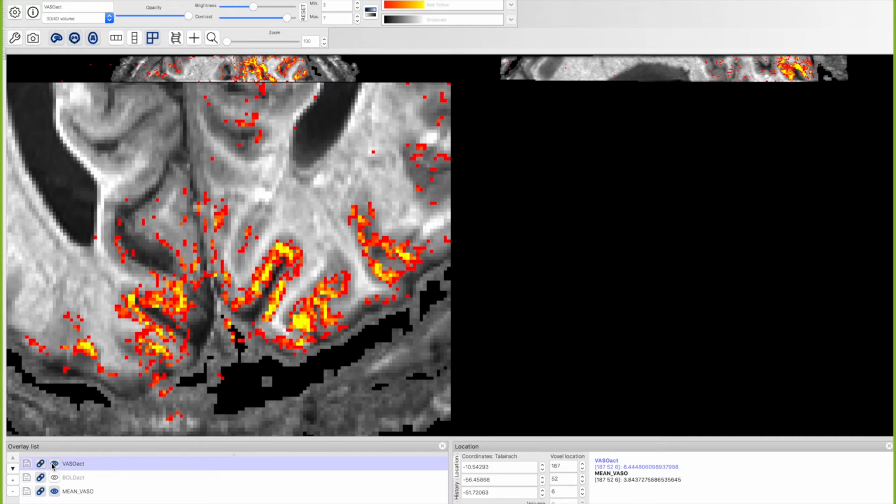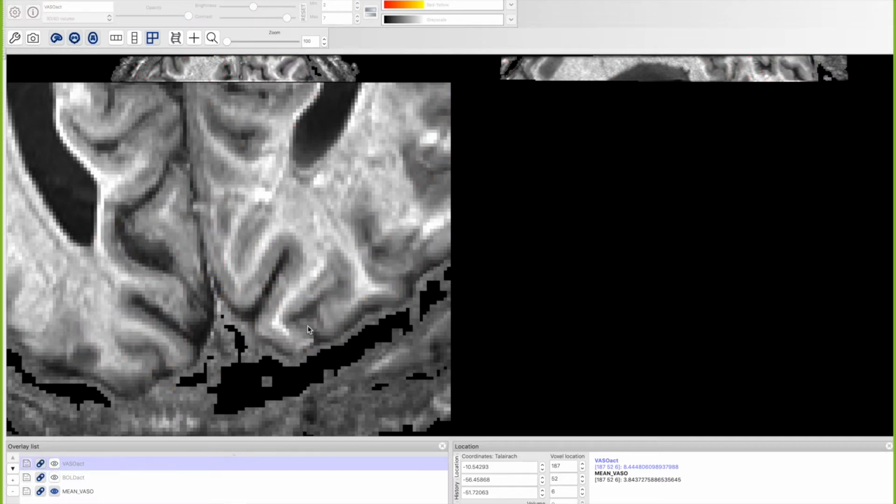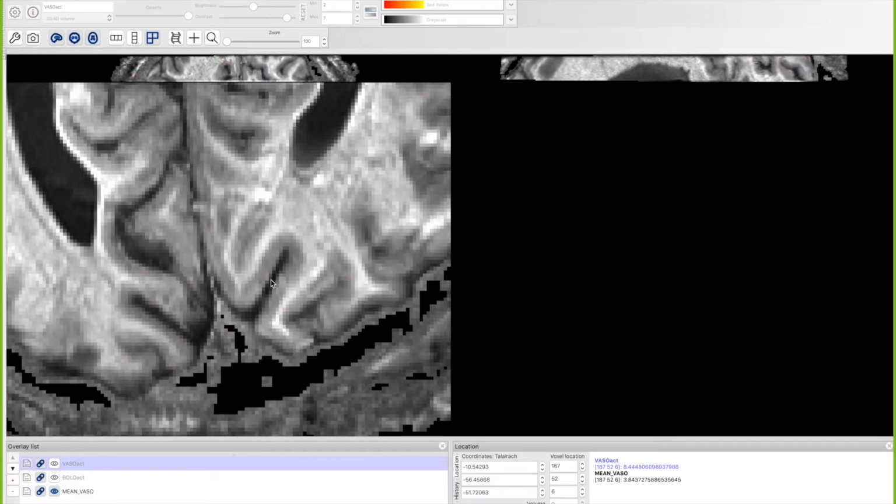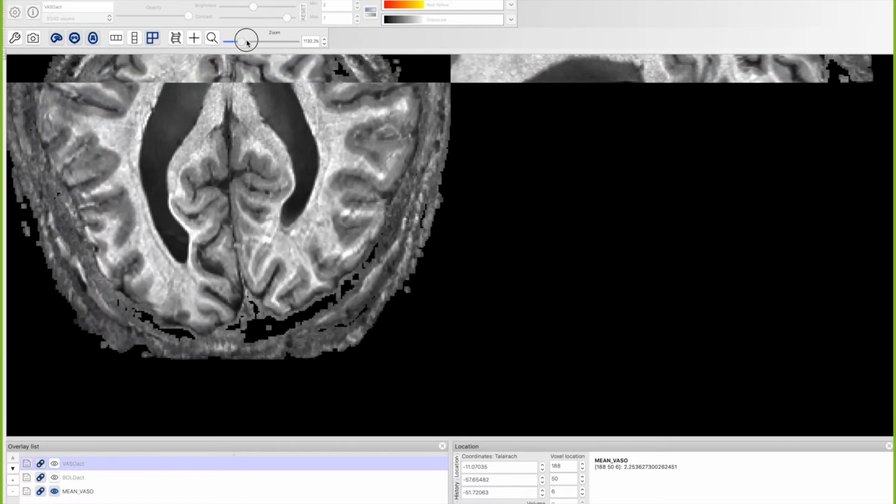And in case anybody of you does not have FSLeyes, we can do the same thing again for FSL View or ITK-SNAP or something. So let's just focus on one sulcus and quickly manually segment this in EPI space. In FSLeyes, I do so by clicking, I'm not sure if you see my video, the Alt and the E key on my keyboard, Alt and E. As soon as I do that, I'm in so-called edit mode.